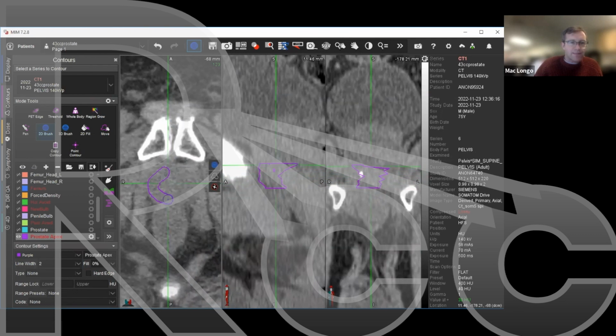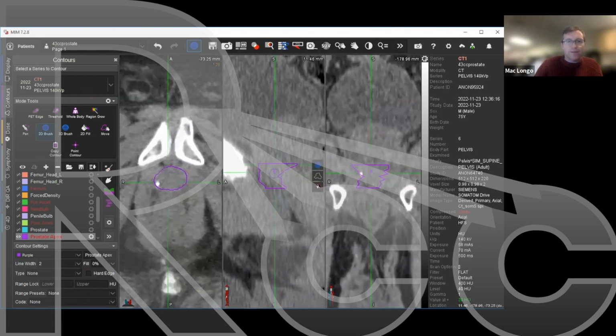This is prostate, but we can see, just looking in the sagittal plane, I'm not going to contour all the way up. We see the way that the tissue appears is all very similar, but we see this pedestal-like formation that's down here. I've way over-contoured the apex of my prostate, and I've gone down through the genitourinary diaphragm into the membranous urethra. So that's far more inferior than I need to go for the prostate.